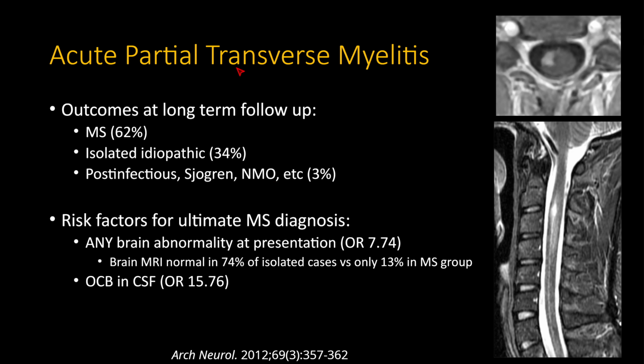So there is a clinical component to this. It's not just that you have a focal lesion, but when you have a nicely defined cord lesion like this and it's focal and unilateral, chances are clinically it's also going to be just unilateral symptoms.